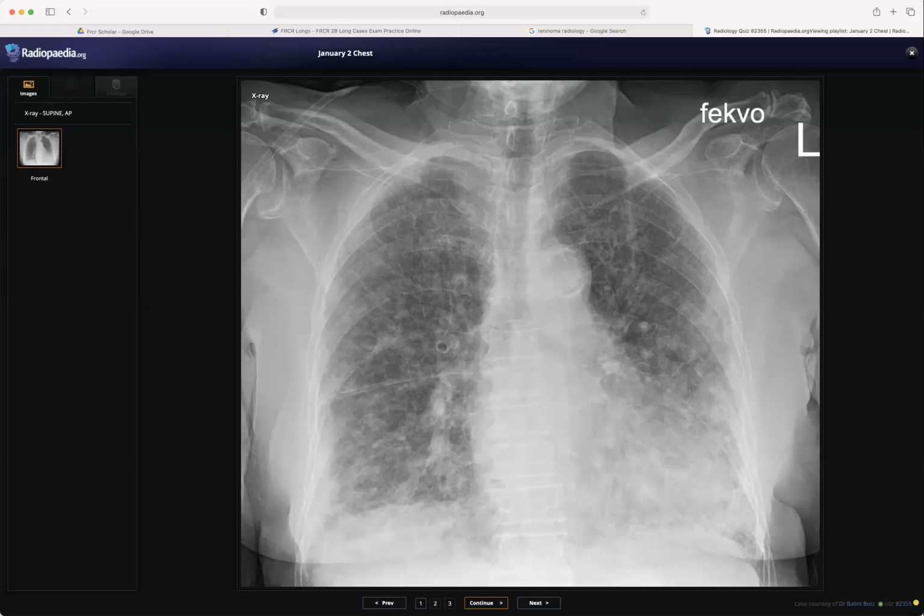And so now I'm looking at the bones. The glenohumeral joints are appearing normal, and in the acromioclavicular joints there are some degenerative changes. Degenerative changes are seen in the vertebrae also. So other than that, I'm not seeing anything remarkable.